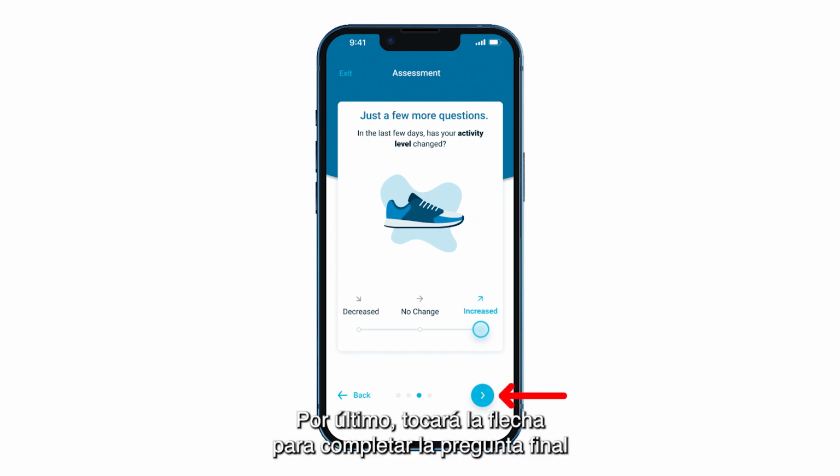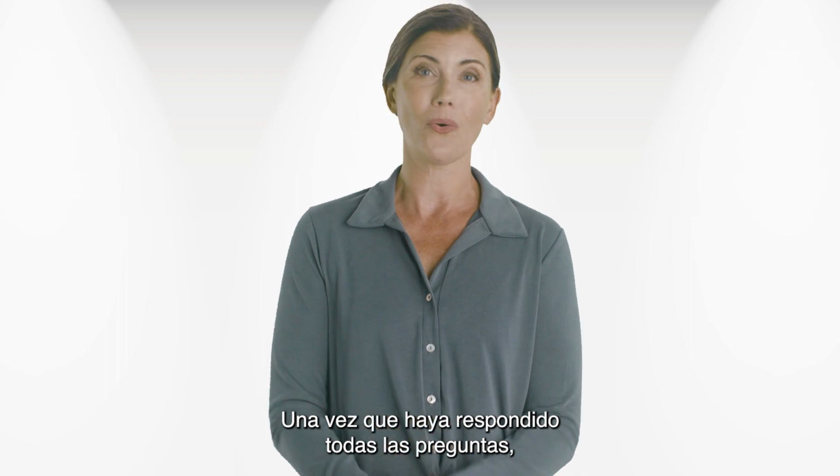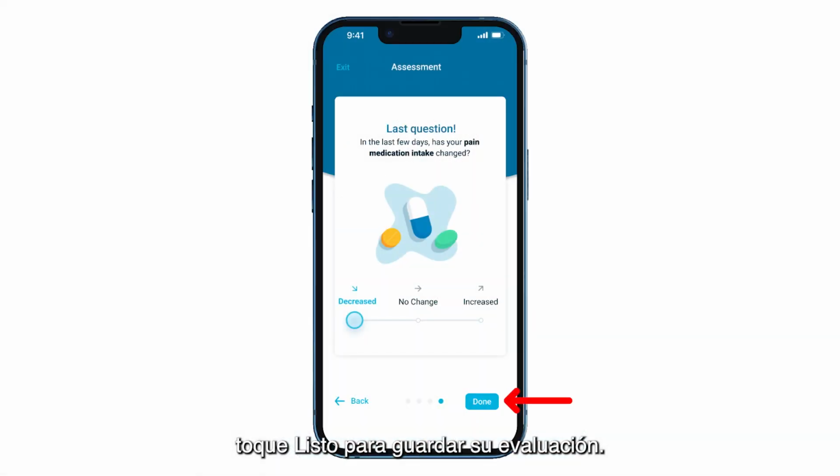Last, you will tap the arrow to complete the final question, where you will note if you have had any change in your pain medication. Once you have answered all the questions, please tap Done to save your assessment.